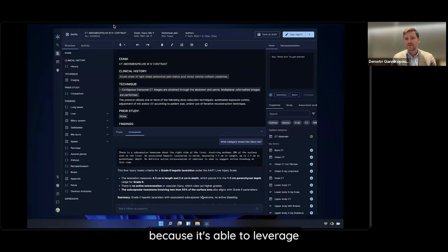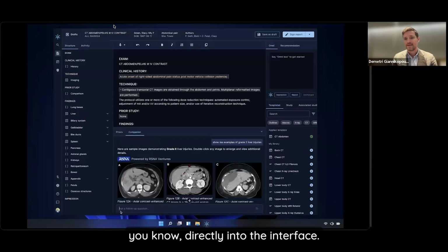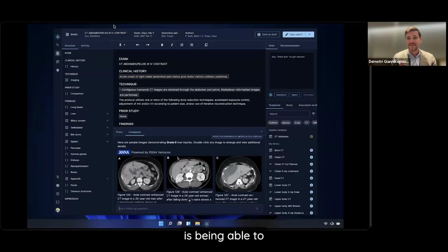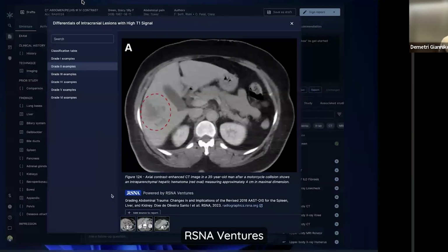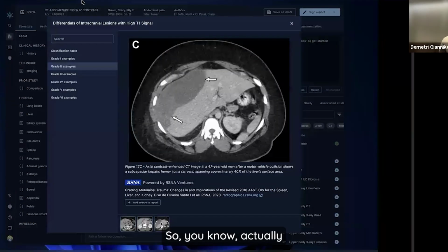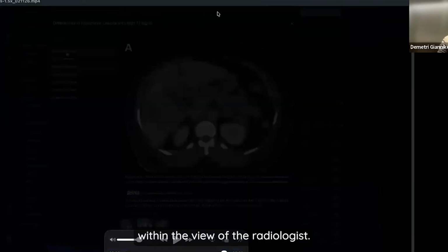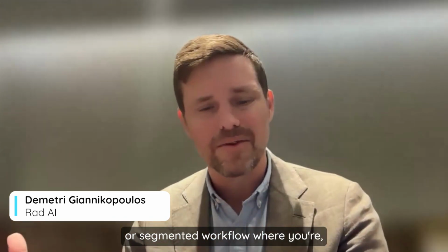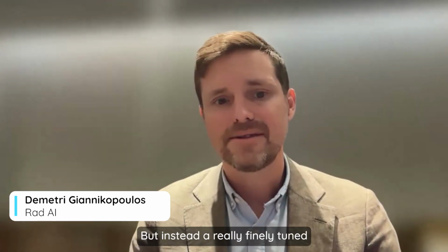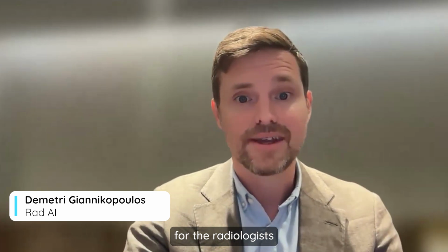Which is great because it's able to leverage artificial intelligence to identify what information is most appropriate to pull out and then put that directly into the interface. Now, the really exciting part is being able to then also correlate that with the information from RSNA and RSNA Ventures directly embedded into that point of care. So actually seeing the markings, if there's relevant Hounsfield units of consideration, all that kind of stuff directly within the view of the radiologist. So really not having a divorced or segmented workflow where you're doing a lot of interactions, but instead a really finely tuned and tailored workflow for the radiologists as they're going through this.